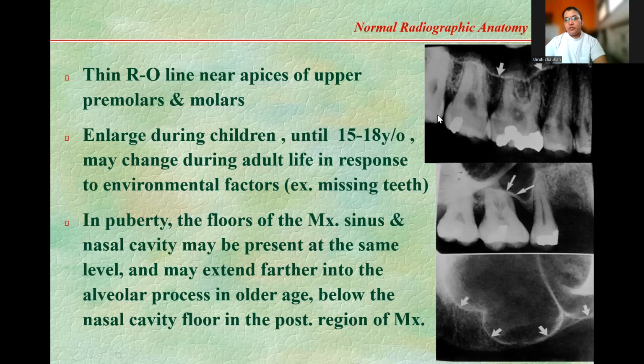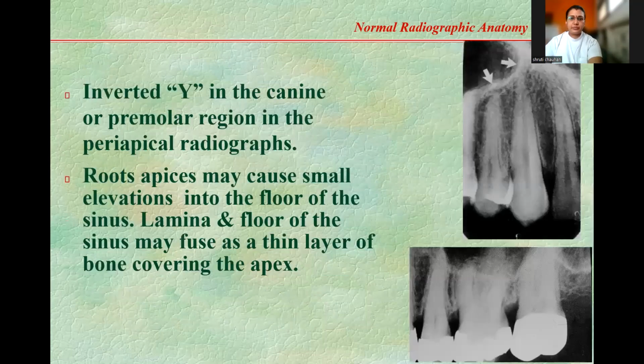Now, I told you about full teeth and fully missing teeth. If you see the second diagram, this shows a transitional stage. Look over here. In between these teeth, there was some space. Because of the bone loss, the alveolar crest has come down over here, and it is very nearly impinging on your maxillary sinus. So this was how it is here.